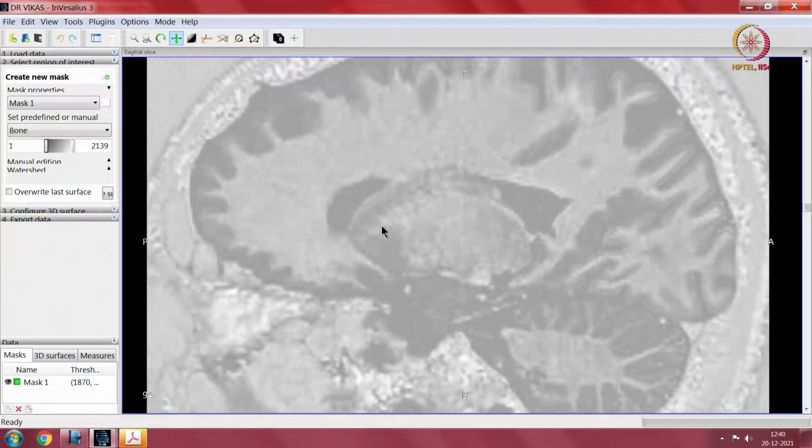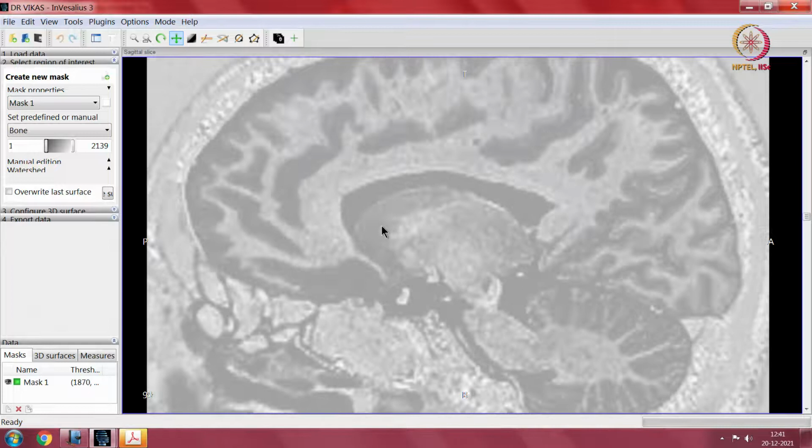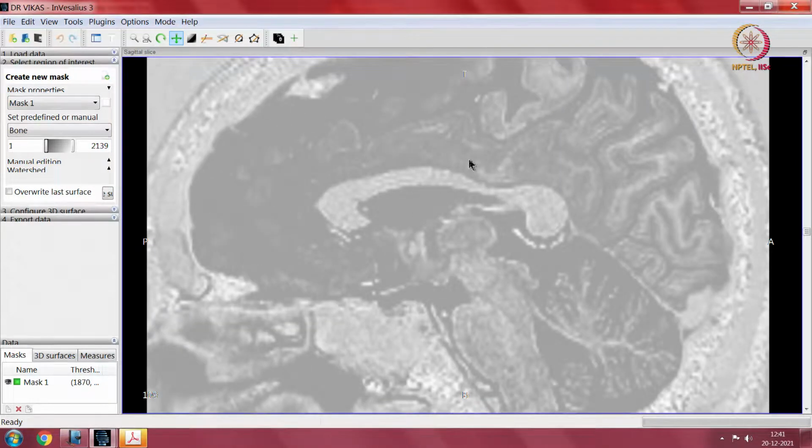Coming up, you go back to the center. This is the center because we are seeing the corpus callosum as a distinct entity. You do not see it in continuity with something else. This structure is the tentorium. The tentorium separates the supratentorium from the infratentorium, cerebrum from cerebellum, and through the incisura, which is the opening in the tentorium, the brainstem and other structures communicate with each other.